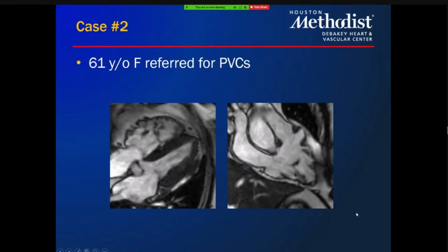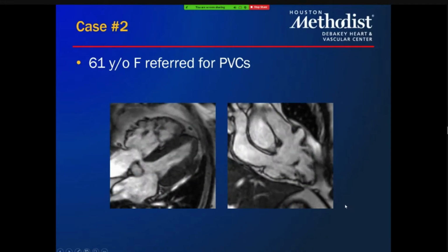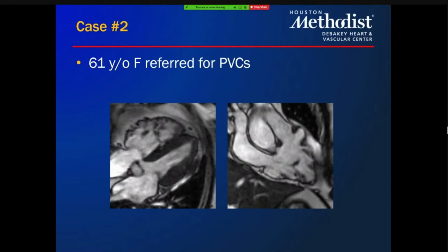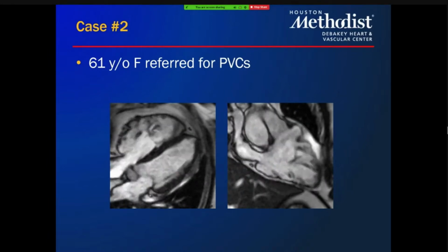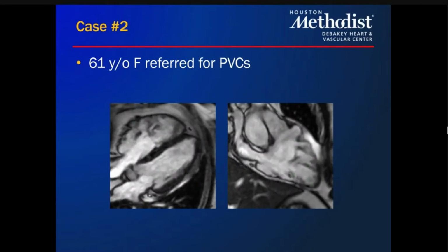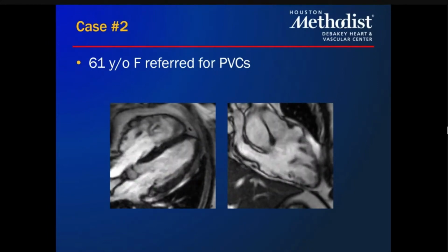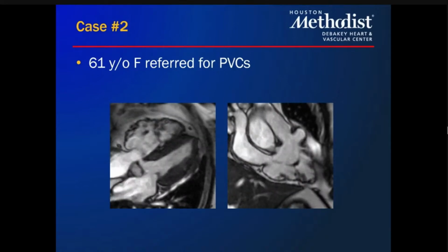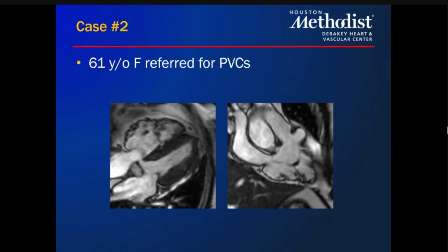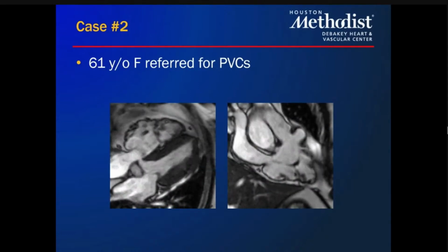Perfect. Thanks. I think it's actually an aneurysm, because if you look in diastole, there's a displacement of the shape. There's an outpouching in diastole as well, right? Yes. But this has all the hallmarks, as Amr pointed out, of ARVC, arrhythmogenic ventricular cardiomyopathy. So much so that this patient went on to get a defibrillator and get the rest of the family screened.